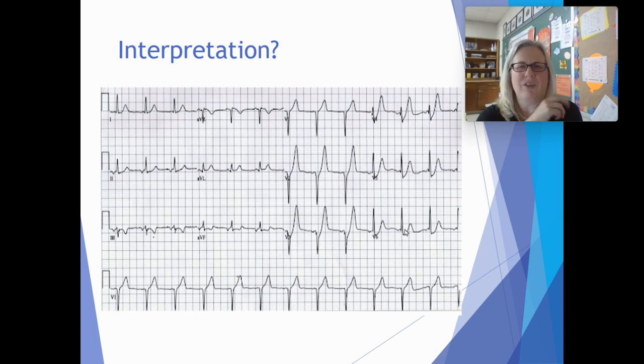Okay. So there's a couple things that could be going on here. Remember what depression means? Depression means only one thing, ischemia. So we have some ischemia, which is narrowing of the blood vessels, which is better than a STEMI. So he's already ahead here. Okay. Peak Ts can mean 2 things though. Peak Ts can mean acute MI. So could be having a heart attack right now.